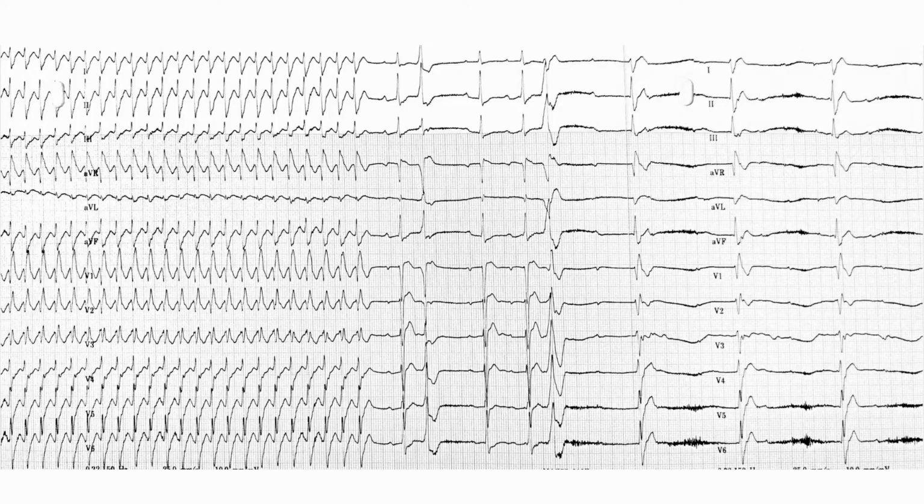In this particular case, the patient was given adenosine at the time that the patient had a tachycardia with a right bundle branch type QRS. As you can see, this is a clean termination when adenosine took effect. There's no PAC or PVC that broke the tachycardia. It broke on its own once the adenosine had taken effect and blocked the AV node. So this is an AV node dependent tachycardia. The two that are AV node dependent are AVNRT and AVRT, and those are the top of the differential.